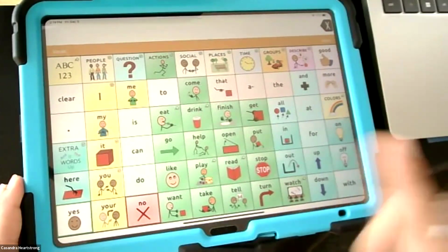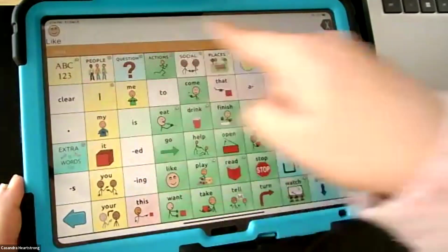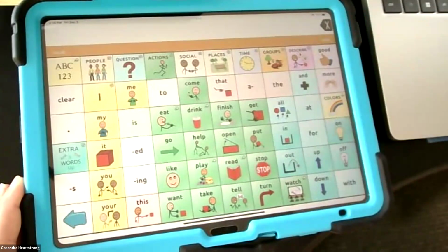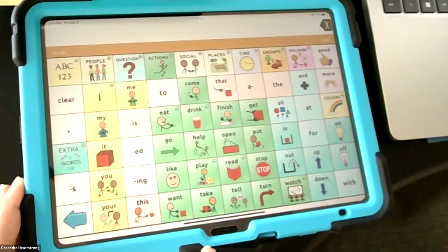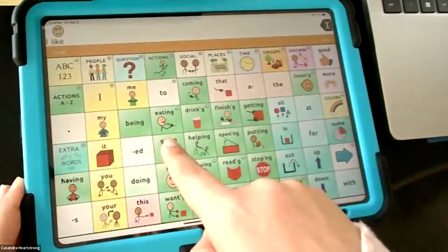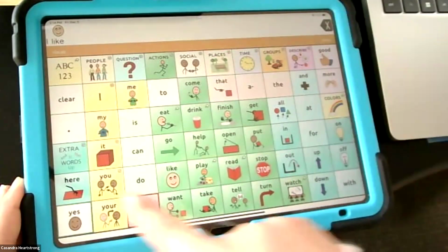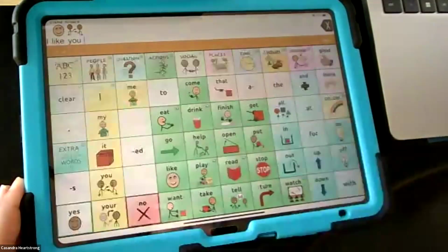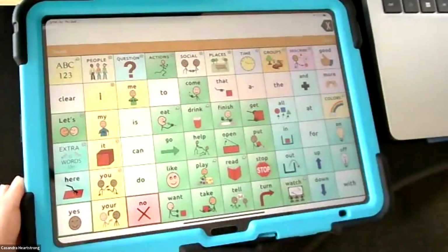You can change the settings so when you touch it, it doesn't say anything out loud. It just builds your utterance up here. So the tap to speak, they also all have a delete and clear function. So delete. I, like, going, oops, I meant you. I'm going to delete, you. And then I can also clear, and the whole thing goes away.